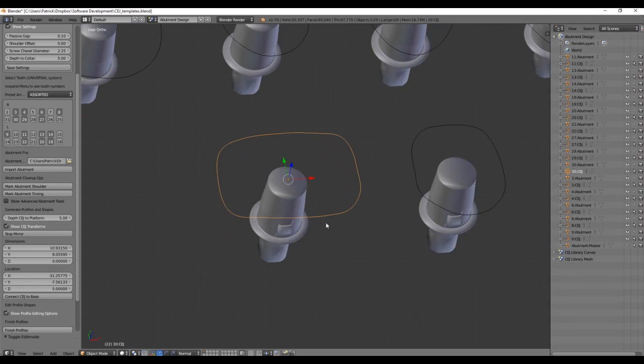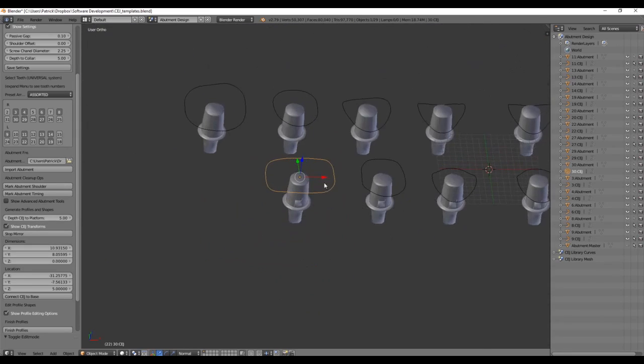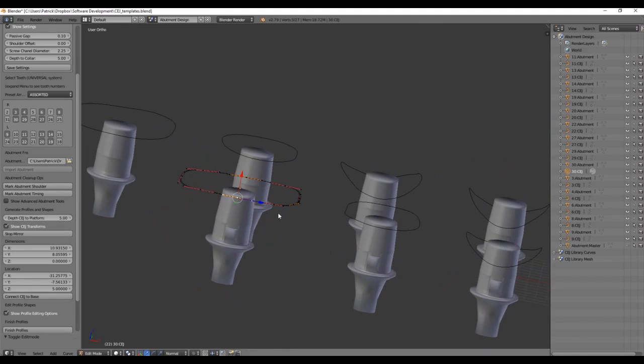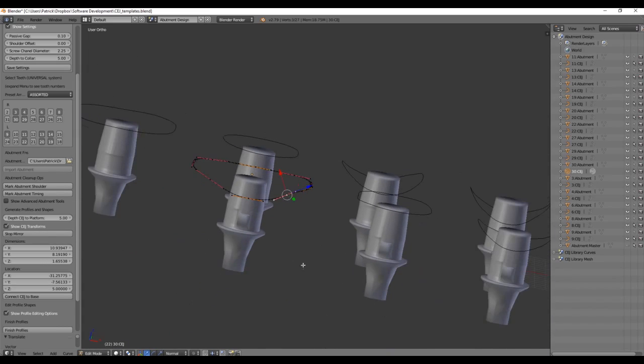So here, not a very practical example, I've changed the profile to a much more rectangular shape as opposed to a pentagonal shape. I also didn't really demonstrate that you can also lower the facial height of contour, leaving the proximal heights of contour more coronal.